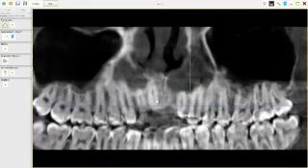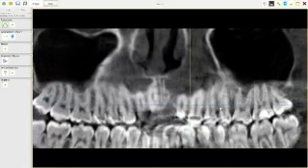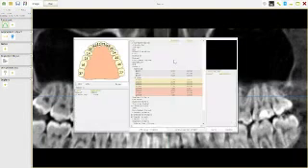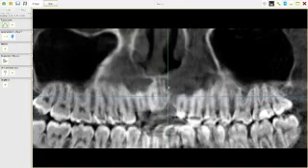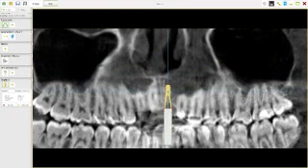Right, so I'm going to scan in and out of there. It's that position there. I can position that green line, as I said, in the middle by clicking it there. I can go to my implants, pick my 375 by 12, validate it, and then I can just position it in this rough area like that. Change it to the square. You can see the square now appearing. And I can move it into this position here, right?